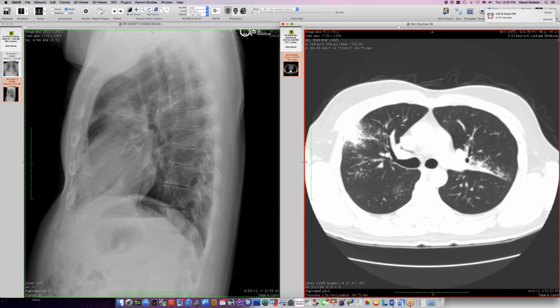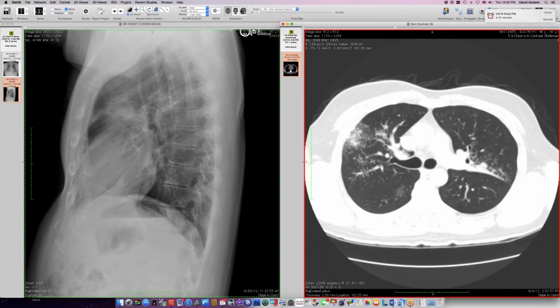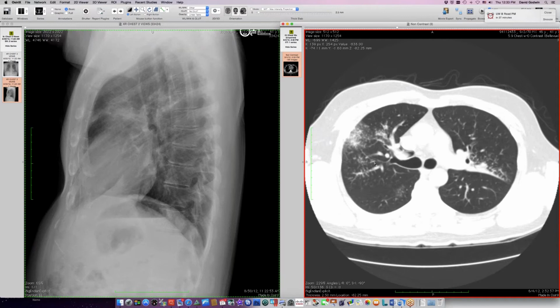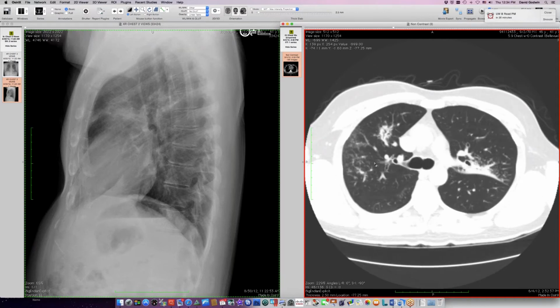I was going to show one. I'm sorry, were you going to propose that from the radiographic findings? No, I have a case of MALT lymphoma that sort of looks sarcoid-esque. I was going to show today, so stay tuned. Okay, we got a series now, a series of less than 100 cases. I would have called this sarcoid other than it's asymmetric. Looks like sarcoid to me. Yeah. Yep. Okay, well, live and learn.